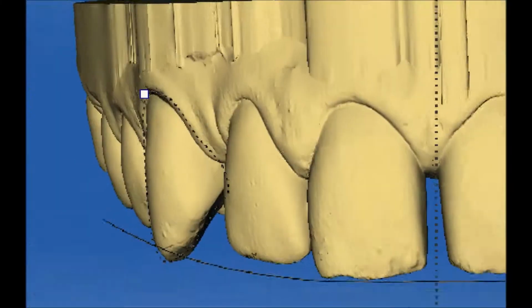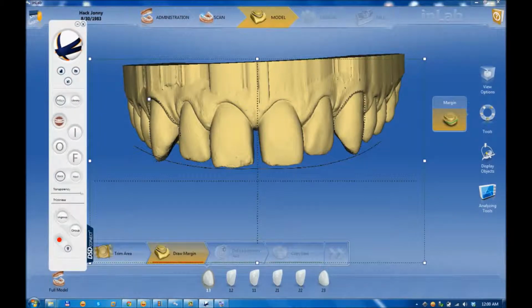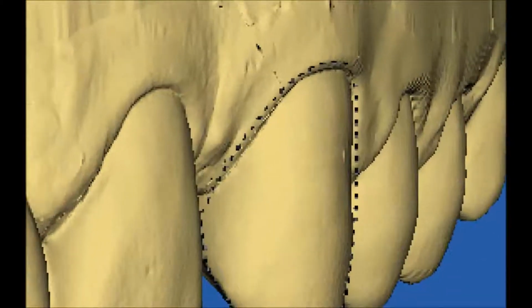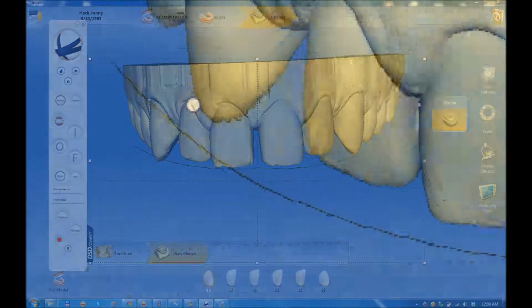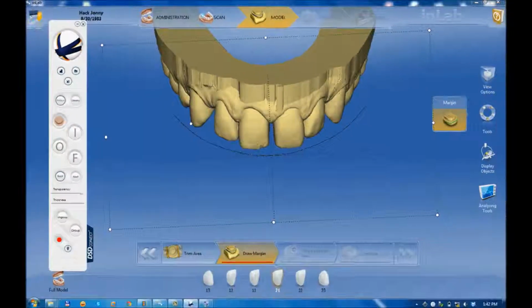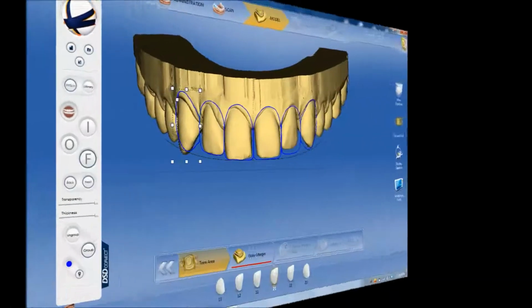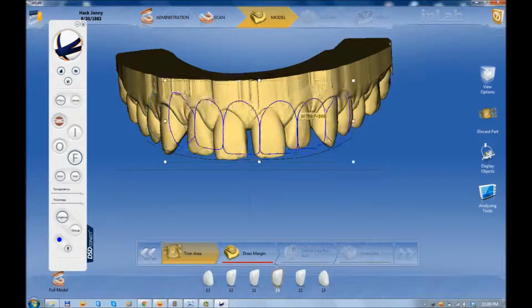The magnifier function is done using the mouse's scroll simultaneously with the zoom on the DSD Connect application and the software to which it is connected, in order to better view the details during the design. Modifying the position can be done with each contour separately or all at once using the group-ungroup function.